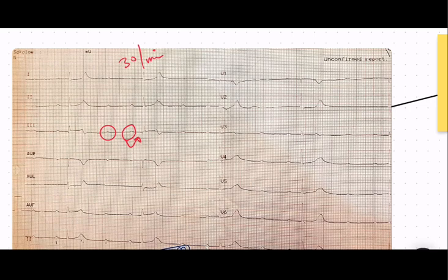The conducted PR interval seems to be constant and is 320 milliseconds. This is diagnostic of 3 to 1 AV block.